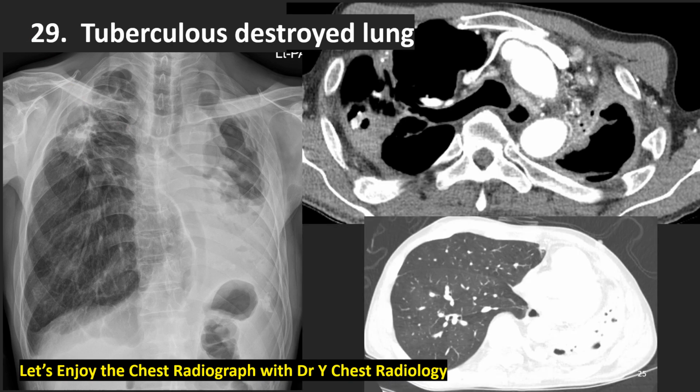Let's look at the contrast enhanced CT. Left upper lung zone is necrotized lung tissue with pleural thickening, and there are many hypertrophied systemic pulmonary bronchial arteries, systemic arteries, easy to bleed, easy for hemoptysis or blood-tinged sputum. And ribs are hypertrophied and intercostal space narrowed.